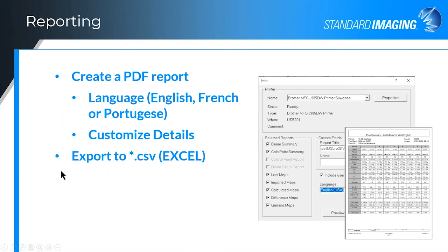And so finally, no QA is done without the report. So we, of course, can create PDF reports. This is a sample of the front page of the plan I'm going to be showing you in the demo. There are 13 pages by default for this report. You can select the details via checkboxes that you'd like to appear in your report in order to customize it.